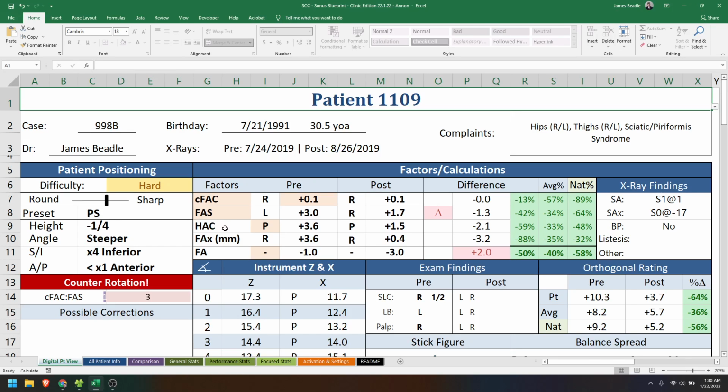So I'm going to go ahead and skip this one. If you did notice, some people had an older Sonus that didn't have this. It now shows the doctor who did the first adjustment, and also what dates the X-rays were taken. That way, if it's been past 3 years or so, it might be time to update those X-rays. It also shows how old the patient is right here. All right, awesome. So now we're going to go to the next tab.